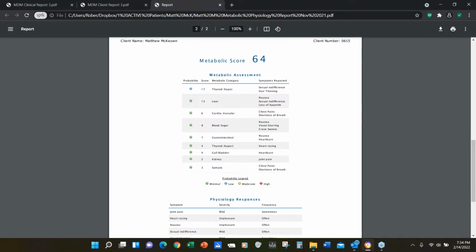And if they have a very high score, where it's like 2 standard deviations, I'll say you might want to get that checked out. But if it's only 0 or 1 standard deviation, I wouldn't say that, because that's not that far out into the tails. But if I see something that's 2 standard deviations or really close to it, I'll say you might want to get that checked out because that might interfere with the neurofeedback. And if they help you with it and you have it, it could reduce a lot of your symptoms. So why not check it out?